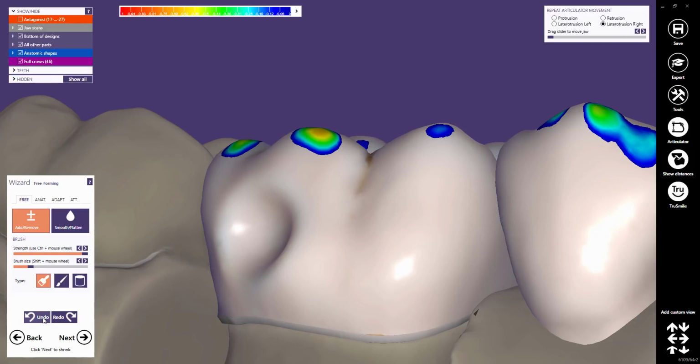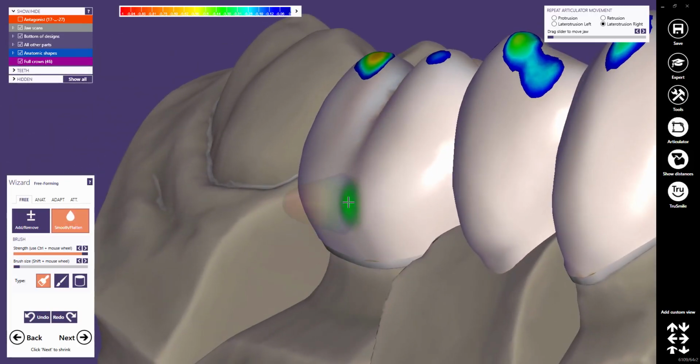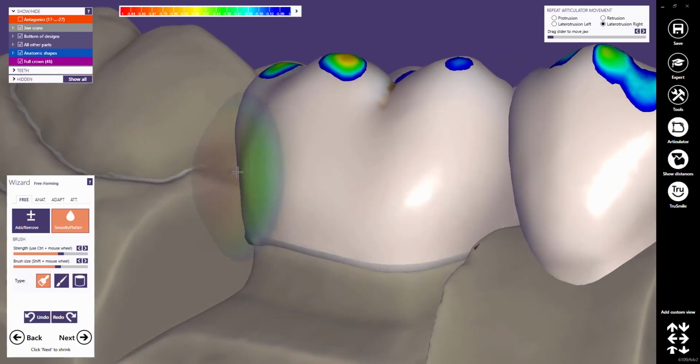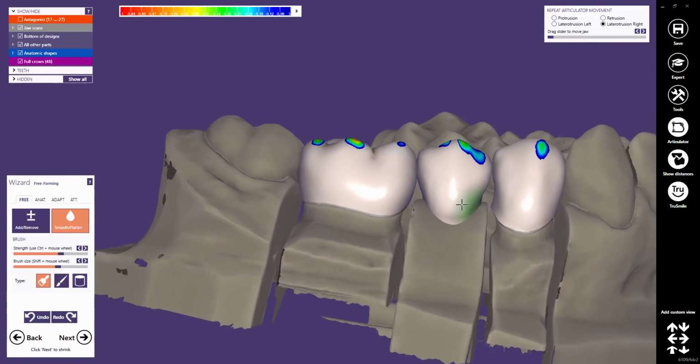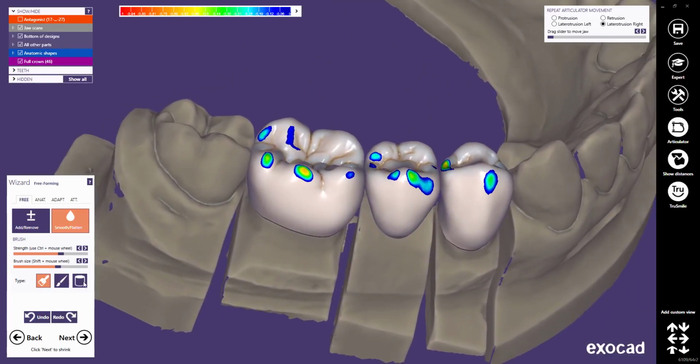Hold the left mouse button with Shift and Control for simple smoothing, or toggle to smoothing. You can change the strength of the smoothing, or perform a very aggressive super smoothing by holding the left mouse button and Shift. To perform shape-preserving smoothing, hold the left mouse button and Control. For both modes, 3 brush types are available.